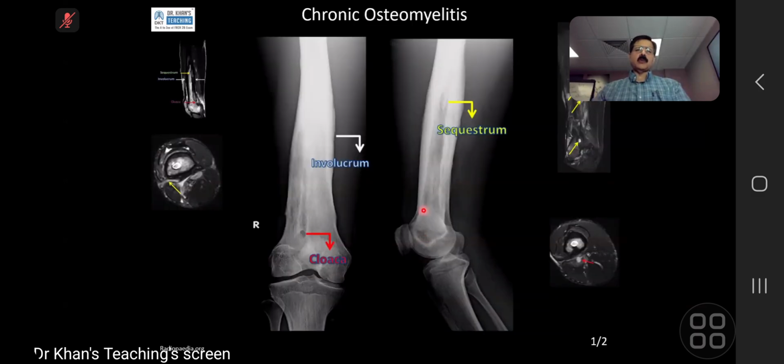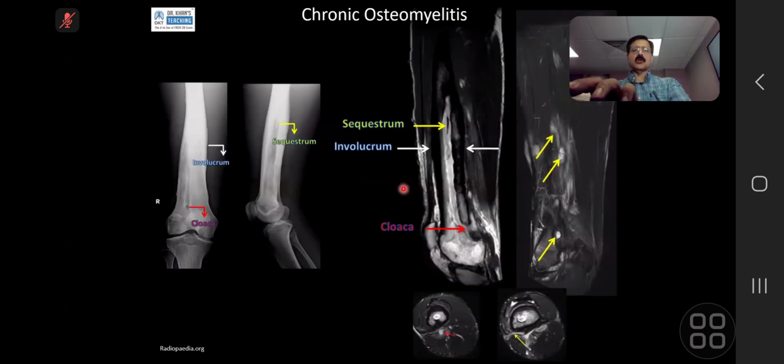Scans from pictures from Radiopaedia. So you can see this lucency here. This is a chronic osteomyelitis. This sclerosis here is sequestrum. And if you see, the cortex has got endosteal as well as periosteal thickening. There is a sequestrum here. Look at the marrow cavity and you can see that it is slightly obliterated. And this is that opening. There is a bit of cortical tunneling, which we will come back to shortly.